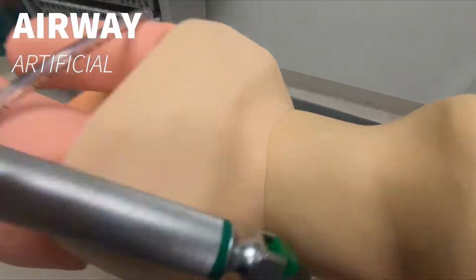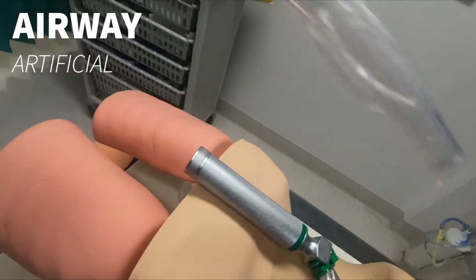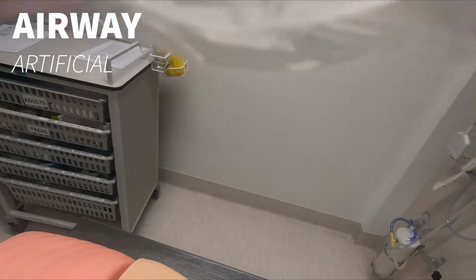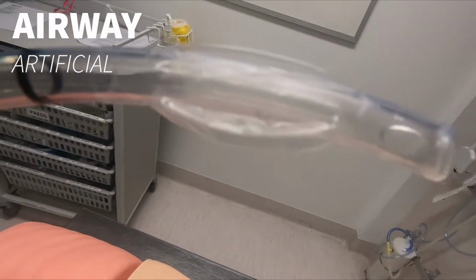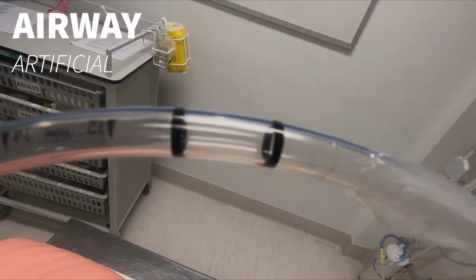So the next level of intervention is the endotracheal tube, and here we have one. You can see here this one has a cuff. If you test the cuff, which would be a natural thing to do, the manufacturer says it is no longer warranted that it will work, but if you don't test this, how do you know it's patent? So it's a bit of a difficult situation.